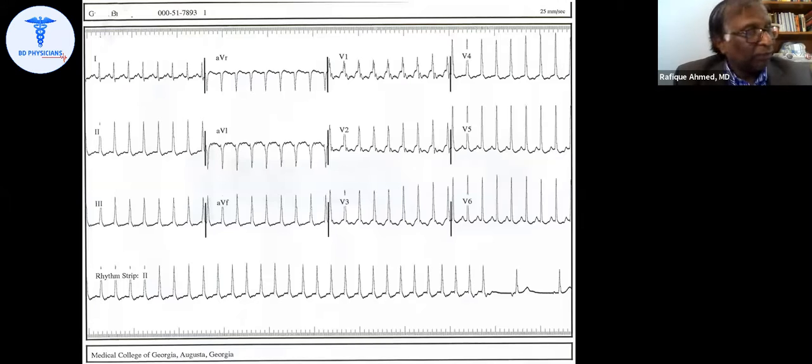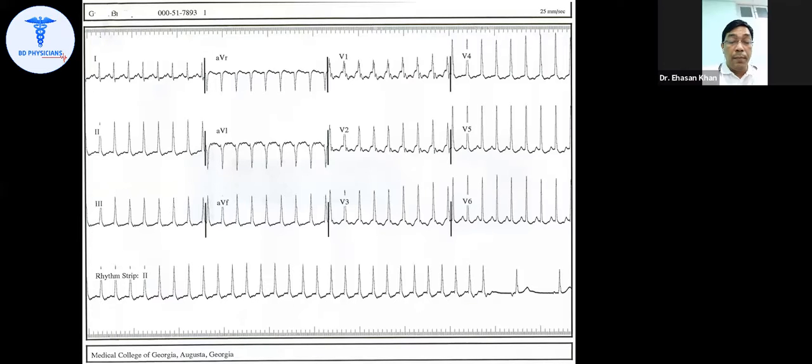How about this one? This rate is close to 200 beats per minute. Who wants to do this? Dr. Partho.